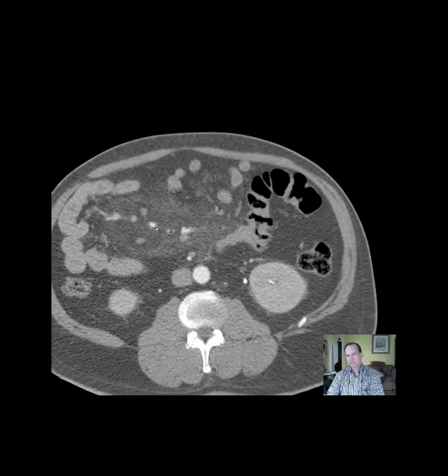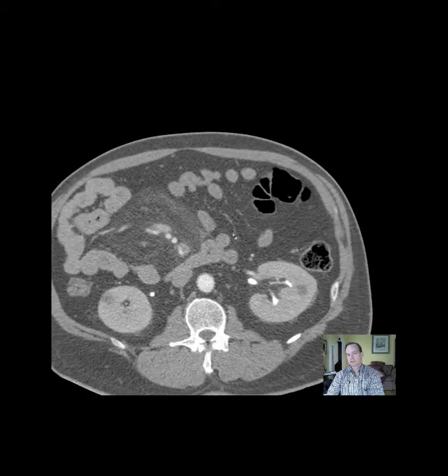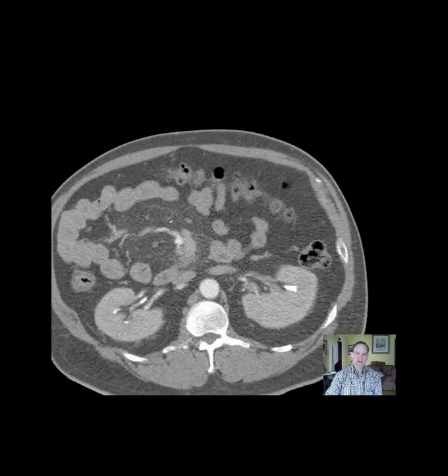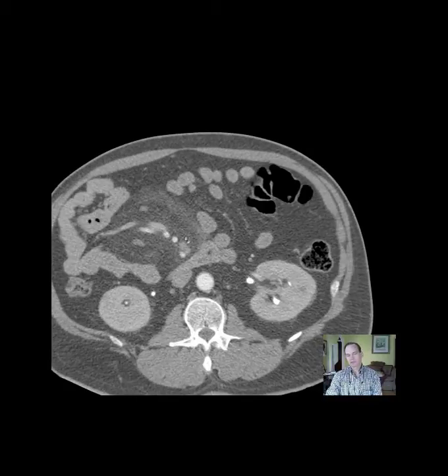different pathologies, and I have posted an article discussing this, Sclerosing Mesenteritis, and that, I think, is the overall catchphrase for it. So if you see haziness in the mesentery, some people just call it misty mesentery, but I think the proper broad term is Sclerosing Mesenteritis, and within that you'll find that there are a couple different descriptive terms.